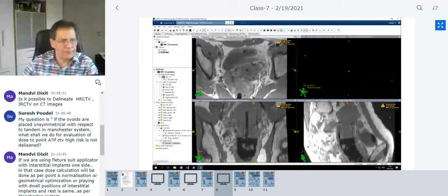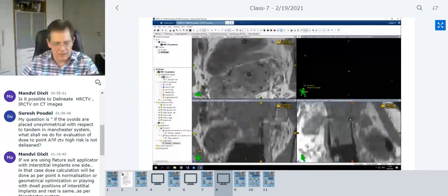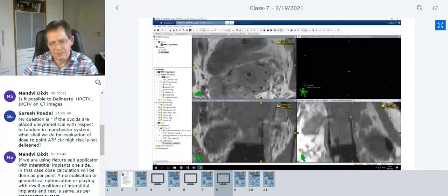How to identify the needle? This is not quite easy. It's a bit tricky, and you need some more information about this needle type, and you would also need a kind of commissioning of the needles to find out where the tip of the needle really is. So we assume that it's not important for the demonstration now, but we assume that the tip, if you do a commissioning, you will see that if you use titanium needles, you get a broad signal at the tip of the needle because of the solid applicator or solid needle. But it's basically somewhere here, maybe a little bit lower.